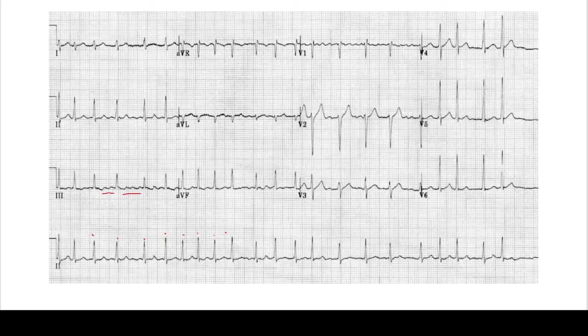You see that there's a lot of QRS complexes that are irregular. They're sometimes close together, a little bit wider apart. If you wanted to determine the rate of this, you usually would have to count out the number of QRS complexes in this EKG because you can't use the box method since it's an irregular rhythm.